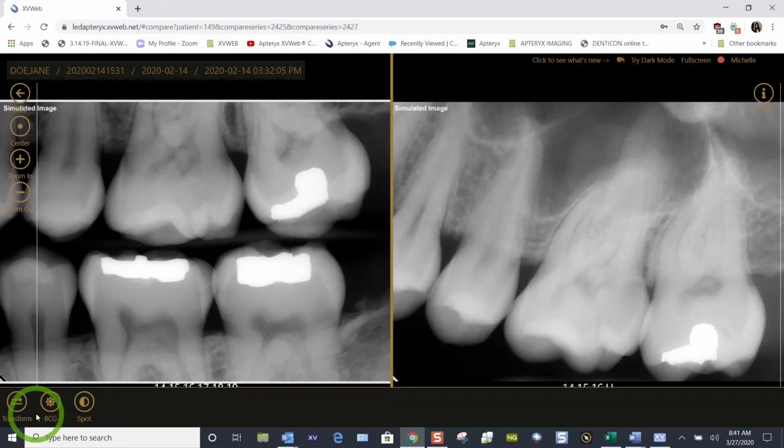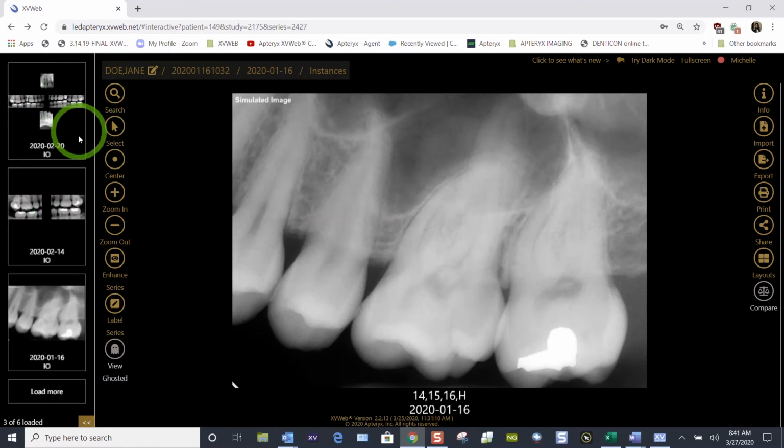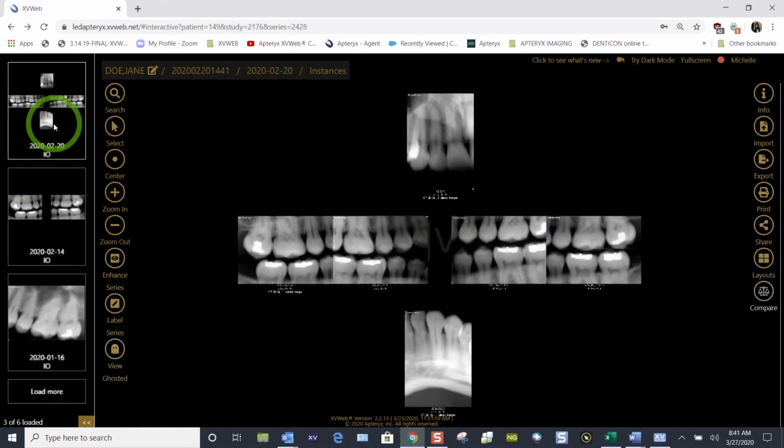But what if I wanted to choose specifically, let's go back, upper left-hand corner, there's a go back button. What if I wanted one image out of several different layouts? So what you do is you left click and choose the first progression. And now you want to click on the select button. That's a left click to highlight it. You see it's got a golden background now.